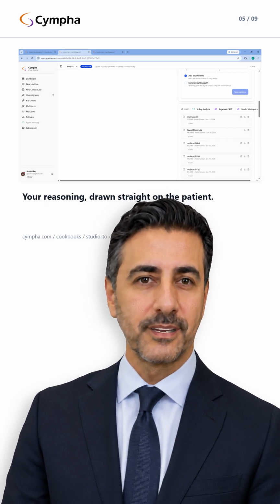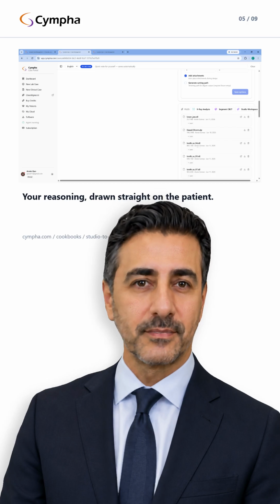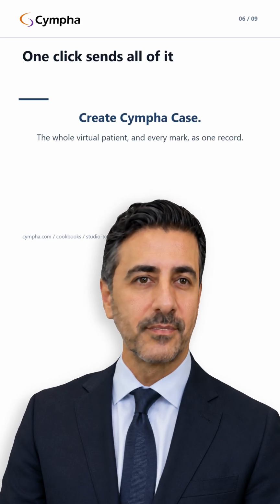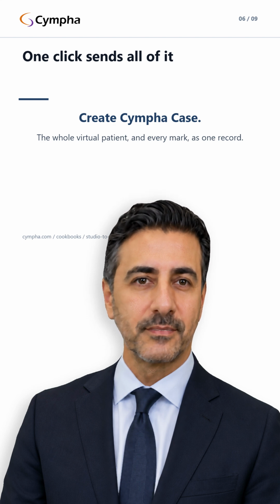This is the whole shift in one picture. The reasoning that used to live only in your head, the concern, the measurement, the angle, now lives on the patient itself. When the designer opens the case, they do not read your intent off a paragraph. They see it exactly where it belongs.